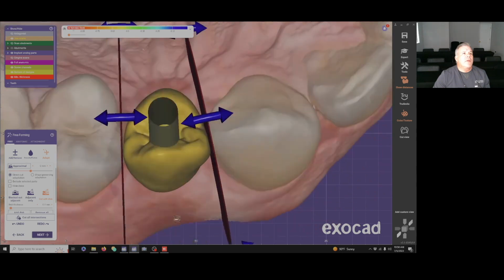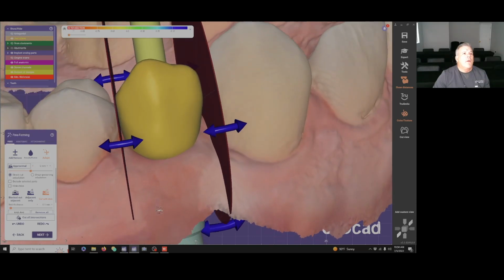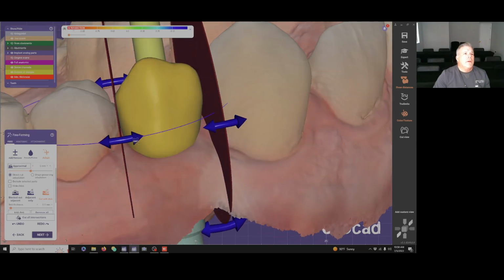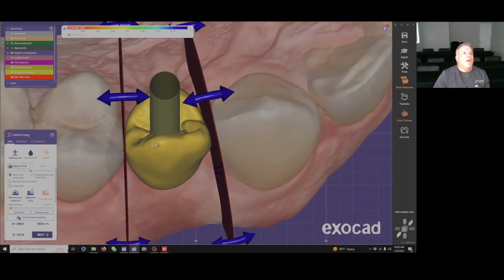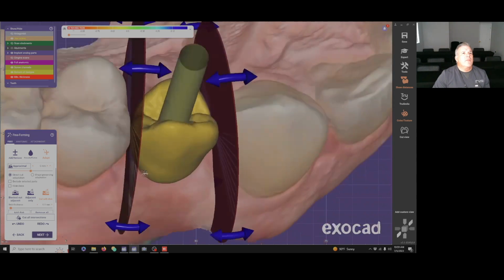And then for the other side, which is where it was actually getting under, drag it over. You can move it this direction to kick the bottom in some, just to make sure. So that looks pretty good right there.